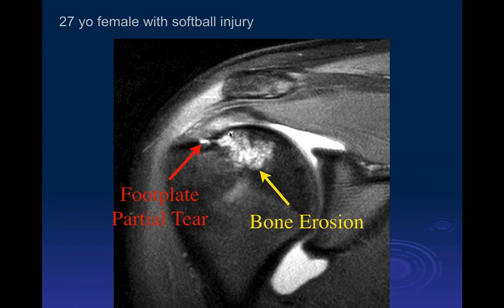By far the most common are traction injuries, really of the infraspinatus and supraspinatus insertional fibers in that location. That's a very strong insertion, and therefore the bone can be the weaker link, and erosions in this location are the rule rather than the exception in anyone over the age of 35. So that's very common. You've all seen that.